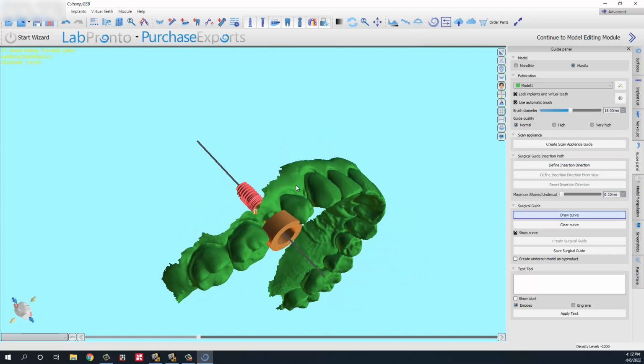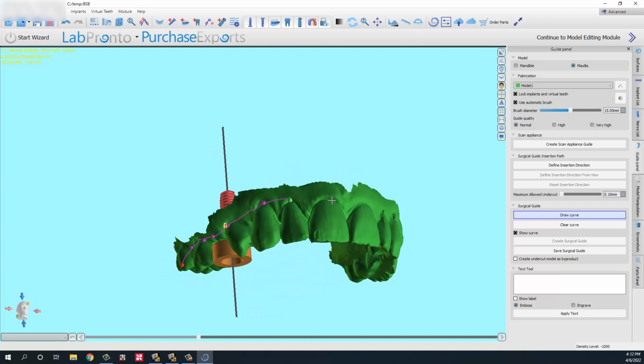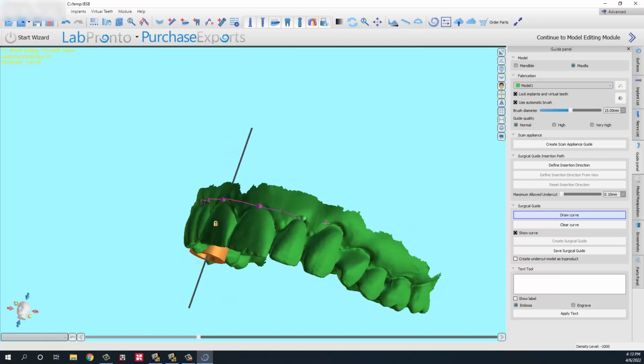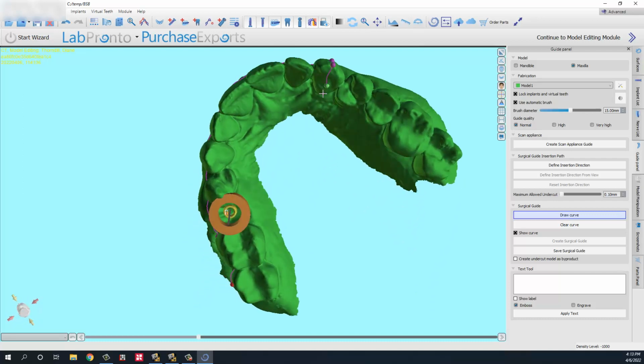I've now begun just clicking. I don't know if I've mentioned that in another video. I actually noticed Michael Saltzman, we were doing some testing of the software, and I just saw him clicking. I was like, are you kidding me? I don't know at what point we were able to start clicking rather than drawing, and someone's probably going to come on and comment and say, oh, I've been doing that for years. Well, good for you.